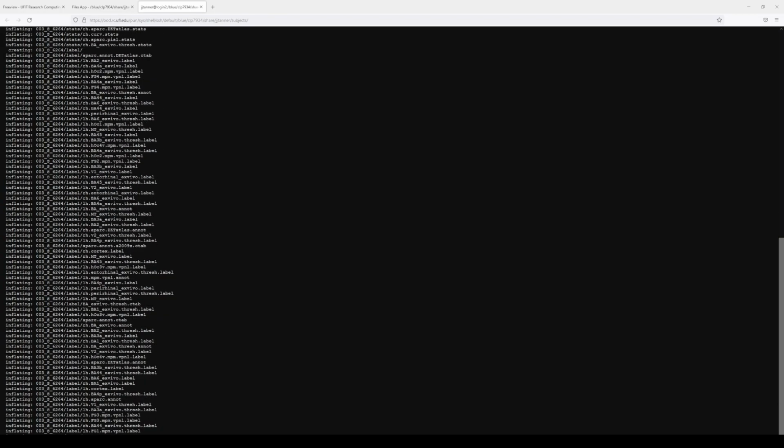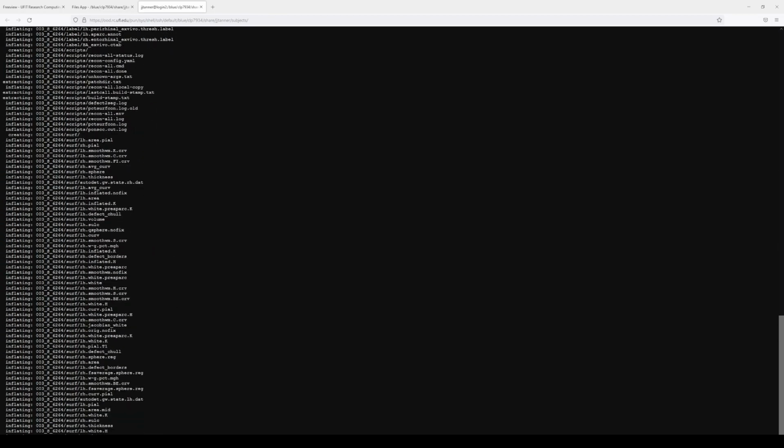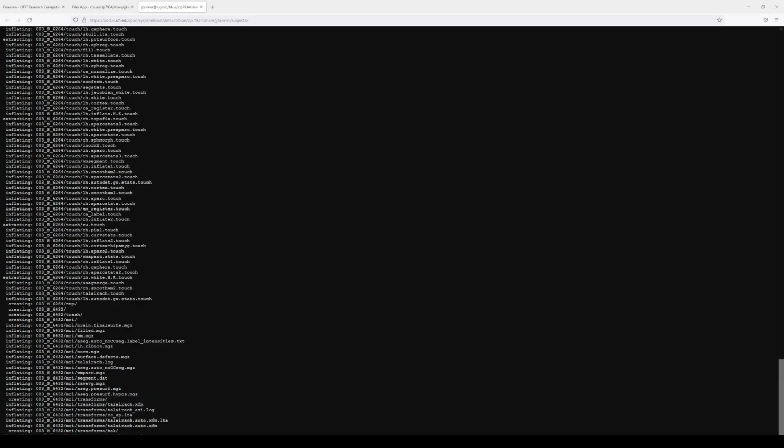And then the first thing I always like to do is get oriented. So in this case, I'm going to list the contents of the directory. I can type pwd and just show that we are where we expect to be. And I'd list the contents of the directory. So to unzip that, I can type unzip and then ADNI. I'm going to tab to autocomplete, and I can press enter. Now this should be fairly quick to unzip.